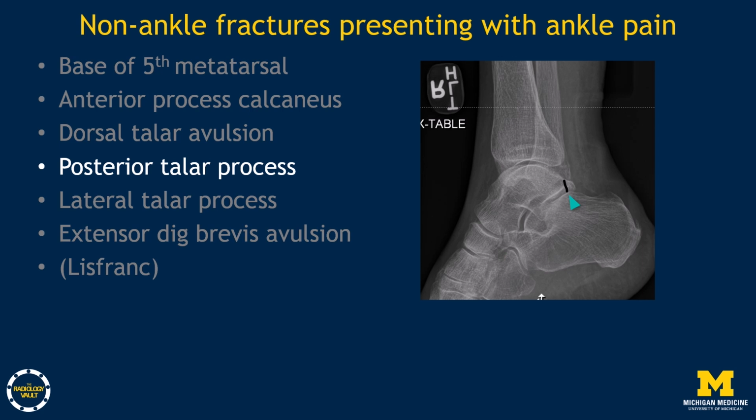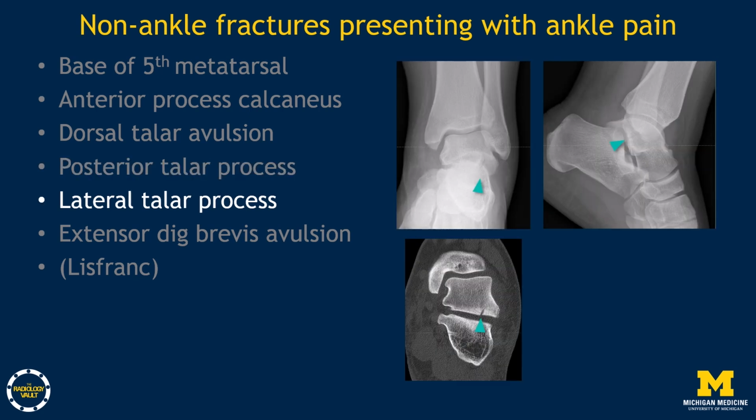The medial and lateral tubercles of the posterior process are separated by the flexor hallucis longus tendon. The snowboarder or lateral talus process fracture is challenging to see and demonstrates the value of CT when ankle fracture suspicion is high.